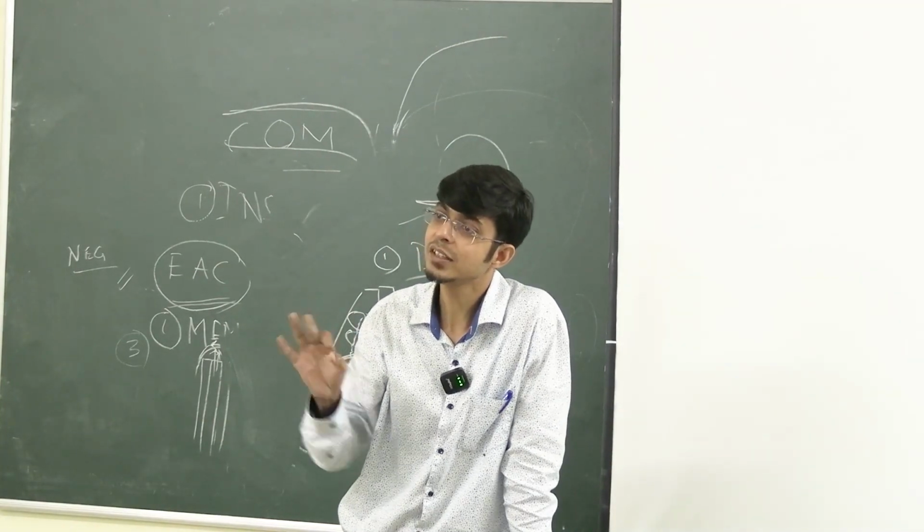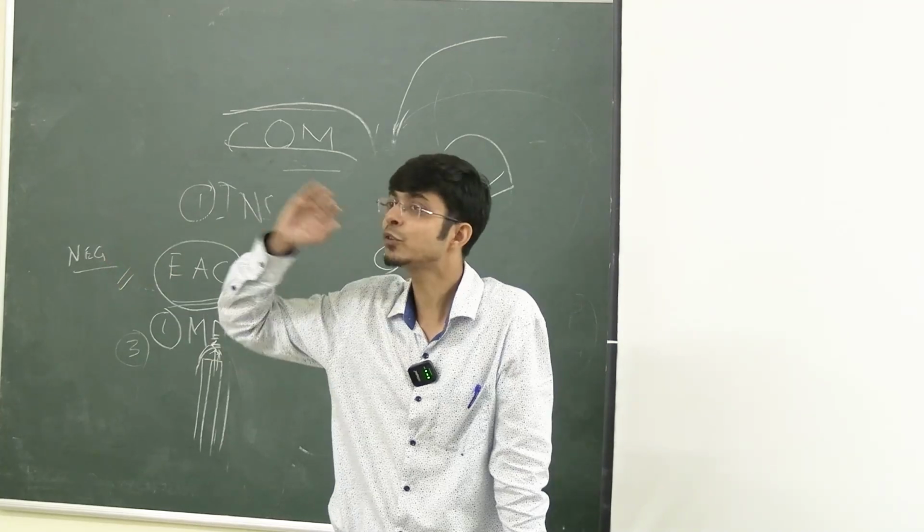মনে থাকবে তো এবার, বুঝতে পেরেছিস? Adenoid is obstructing choana, discharge পেছনে যাচ্ছে না, কোথা দিয়ে যাবে?